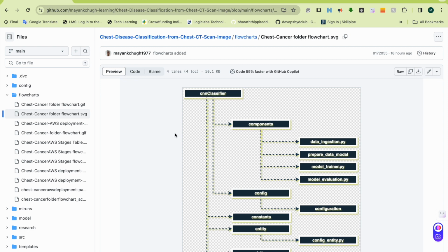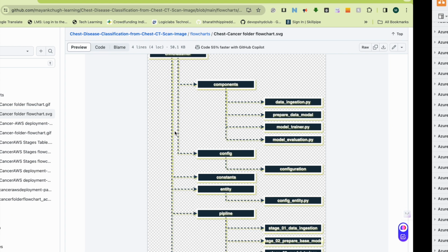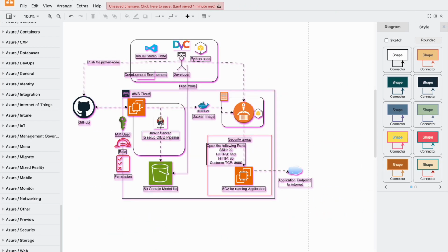Yeah, so this is all about the project. Currently I have already executed this project and it is running in one of my systems. I have done this project on my Windows system because TensorFlow is easy to install there, and the code I have written in TensorFlow is quite easy to do there. And I have everything here in a similar way.